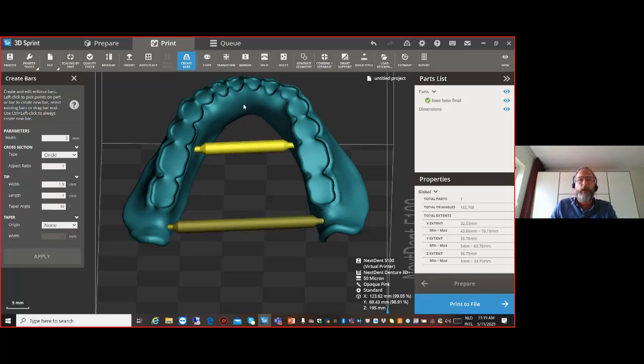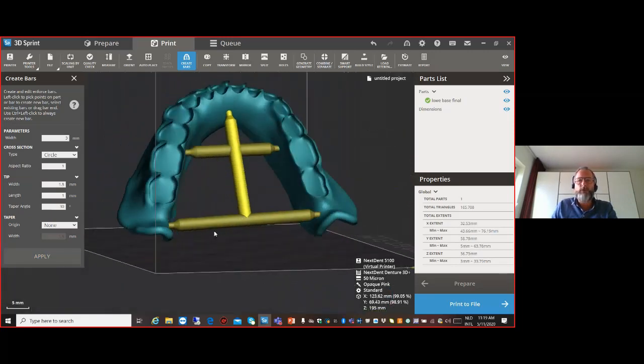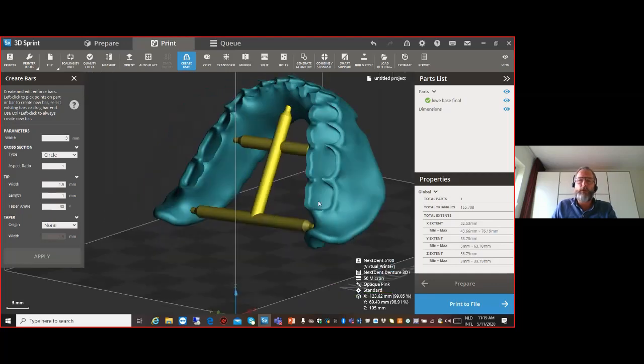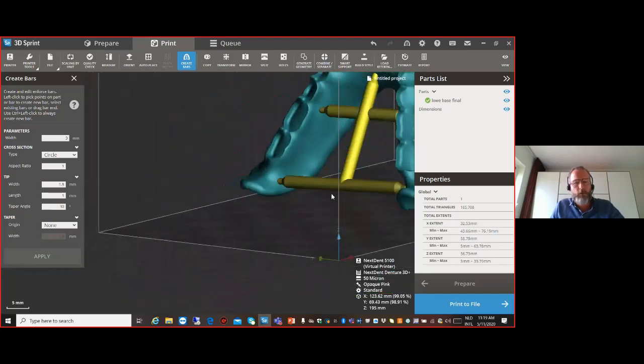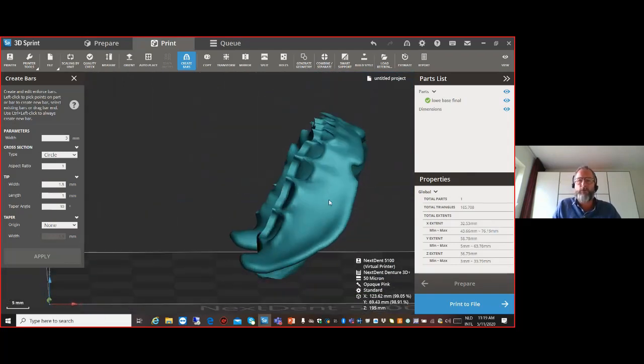Apply. And then if we connect those like this, this will give you a robust build throughout the printing. Printing is done in layers, as we all know, and this way we can now have a stable and robust build, making the end part slightly more accurate.